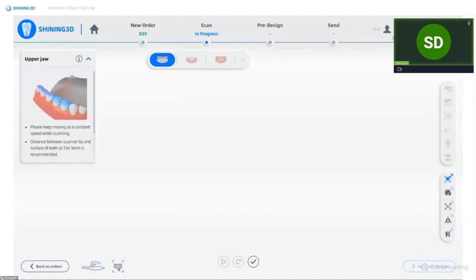On the contrary, sometimes if you scan with more frames, it will affect your result. So just keep in mind. Usually we will scan around 1,000, most of the time under 1,000.